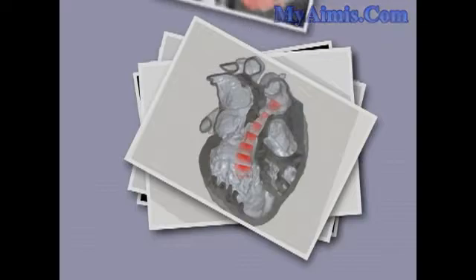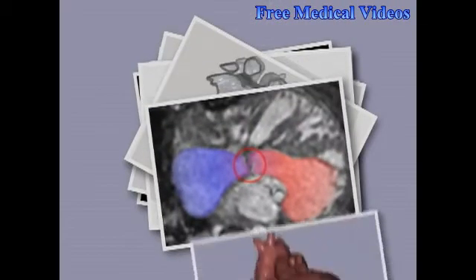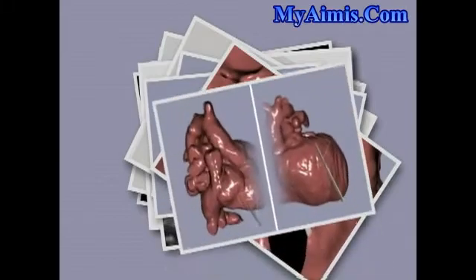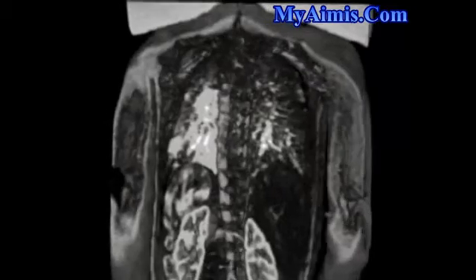Show how different real-time computer graphics techniques have emerged as important tools to aid in the diagnostic and surgical planning processes in patients with congenital heart disease. Magnetic resonance imaging, in short MRI, is an imaging modality capable of producing three-dimensional morphological information.